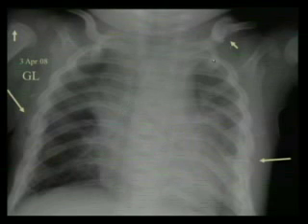This was an abused child. The most commonly broken bone of the body is the clavicle. This is a clavicle fracture that's healing, but don't even worry about that because that doesn't mean diddly. What does mean diddly are these healing fractures out here, multiple healing fractures in a row on both sides. Posterior acute rib fractures, there's no periosteal reaction. Here there is callus. Here, posterior rib fractures, here's a posterior rib fracture, and there's a metaphyseal corner fracture.